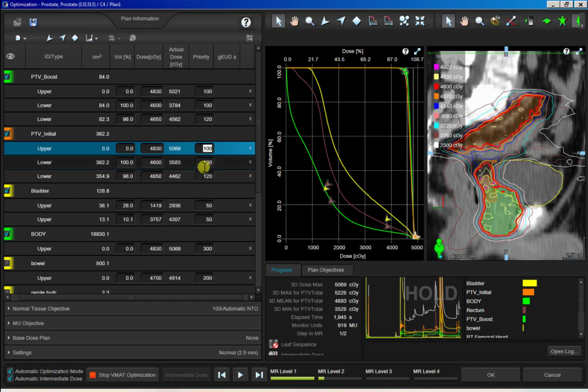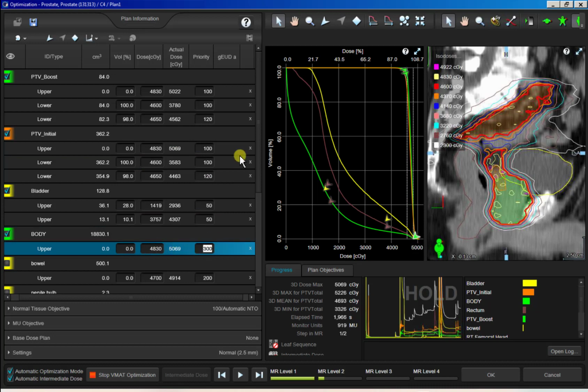But don't take my word for it. Experiment for yourself. A big part of learning this is just experimenting. If you have an idea, try it out. If it doesn't work, start over, no problem. You need to test the software and see some of this for yourself. But anyways, this is just a little tip. That's what I do. So in level 2, add those 3 objectives, or just add an extra lower on all your targets.